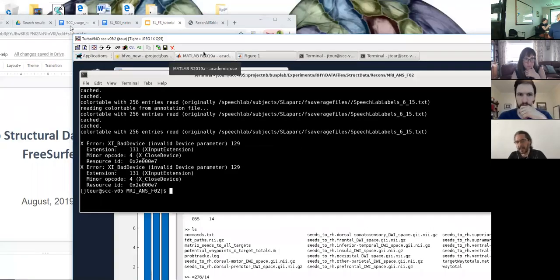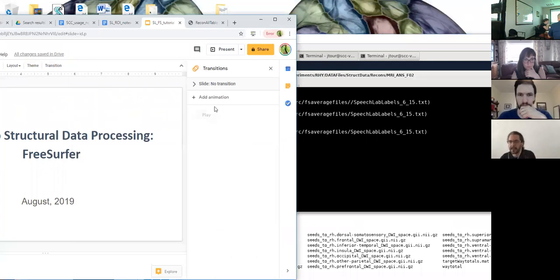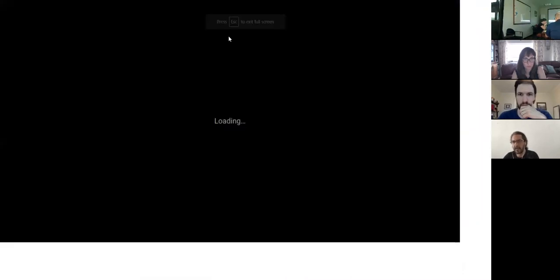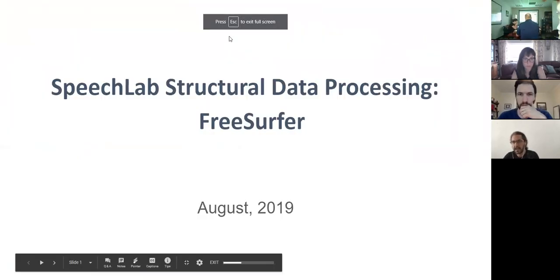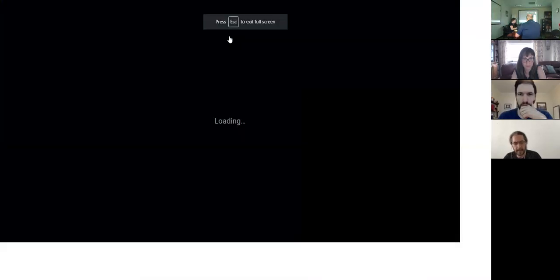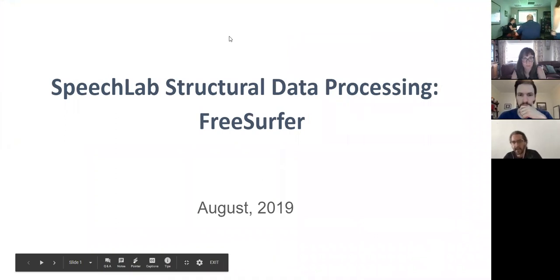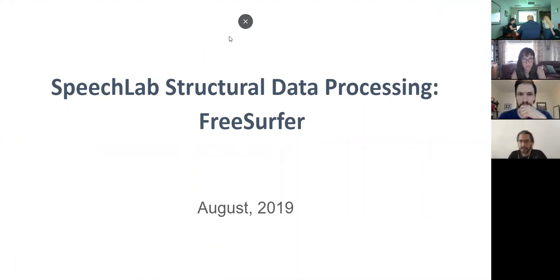Yeah, and that's what I use for the whole brain. That's what I was doing. Right, so that's exactly the same that you need to use for the ROI. And then instead of counting manually, you can just enter an ROI file to extract those numbers from a specific set of sub-ROIs, and instead of computing the average, select the option that says compute count, basically. It's just summing the number of ones that you have within each ROI. Okay, and I can do that through the REX GUI?